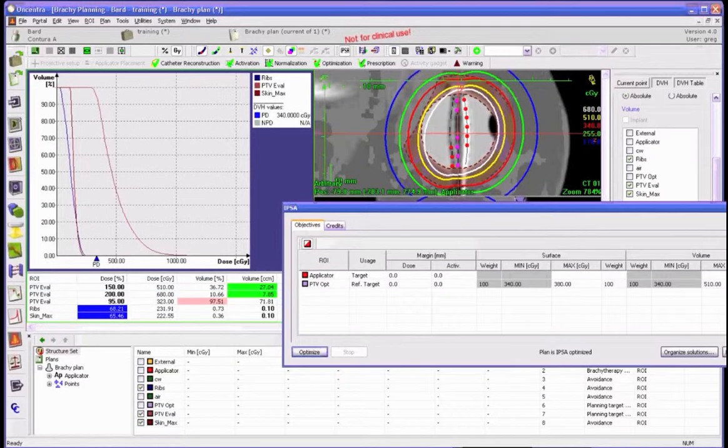Here we go. This 40 weight is probably a little high, and so what we want to do is, no, it's a little low, because what we want to do is reduce our coverage here to make these better. So we want more homogeneity, so we will increase the weight of our homogeneity objective here. So I'll take this one, and I will increase its value. When you start playing with these values, I would make large changes in them, and then once you see what the effect is, then you can make smaller changes as you get close.